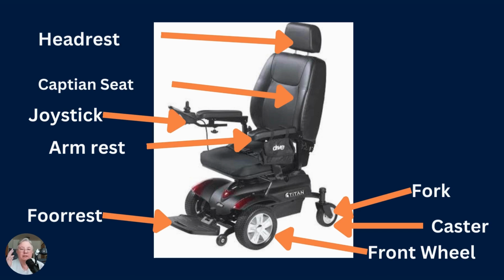Some of these parts are really obvious, but some parts are not. And sometimes we go into blanks. It's like, oh, what was that called? Because something's not working okay, and I gotta call the salesperson, or I gotta call the garage and see what we can do. So this is just a little help so you can go back to this and figure things out. Okay.